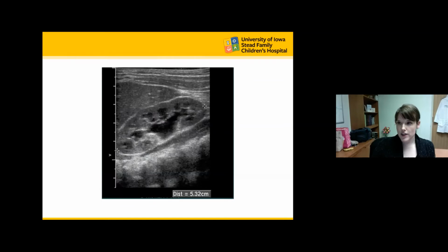So this is a picture that I brought up from Seville, a pretty standard picture of a renal ultrasound, and I just wanted to get your opinion as to, using the SFU criteria, what you would grade this in terms of hydronephrosis.